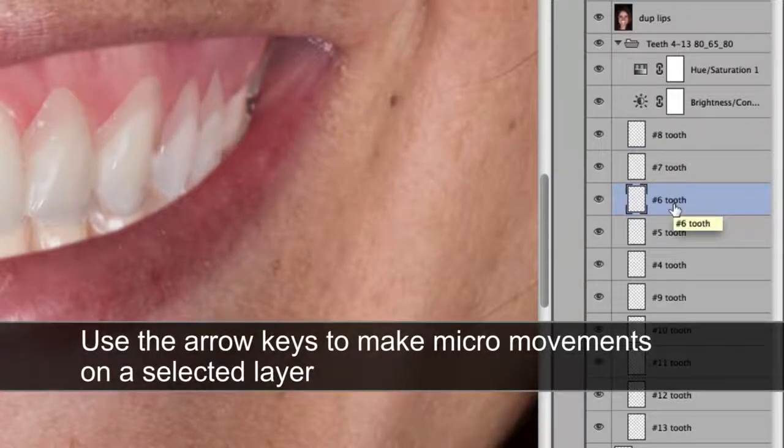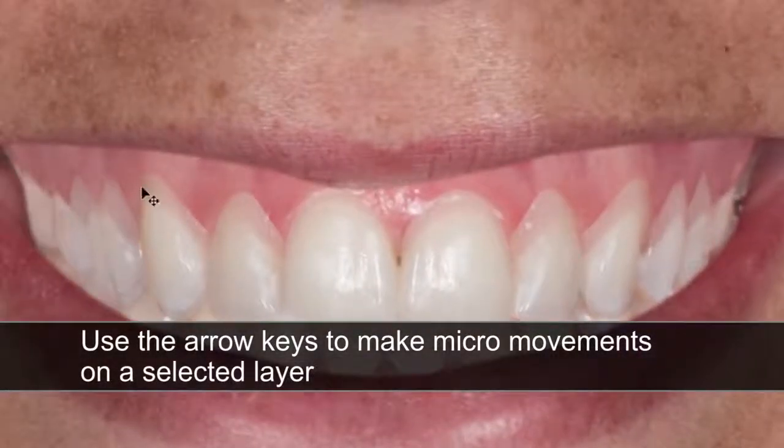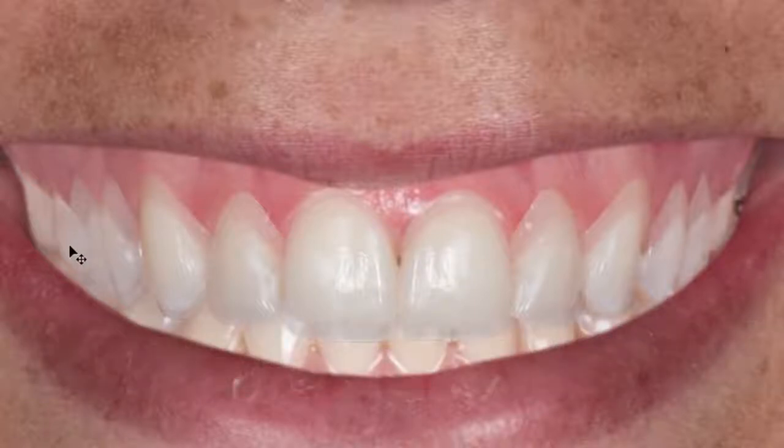I've got to move number 6 over and see that that line is consistent with the contour of her natural tooth there. So I'm going to have to do something there and probably widen the canine just a little bit to blend in with the bicuspids, because she's a little bit fuller over here, and I think that proportion will be okay. And then let's work on tooth number 5 and bring up the box on it. So let's improve this just a little bit because I can't narrow that tooth too much. I probably can come in just a little bit on that bicuspid over there.